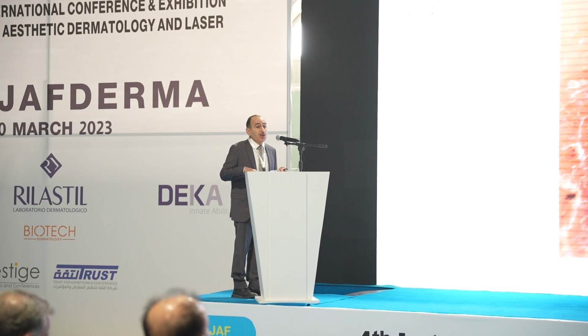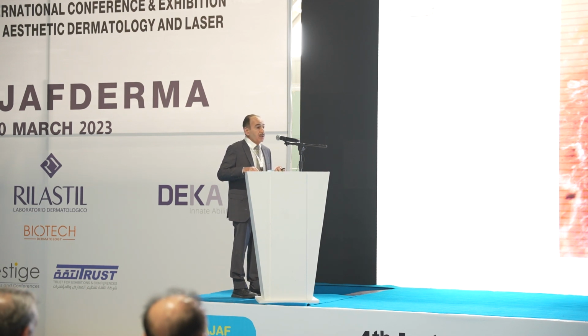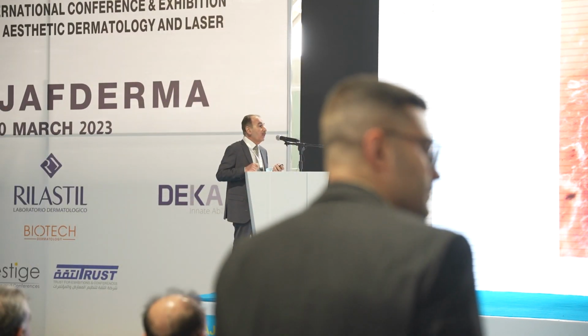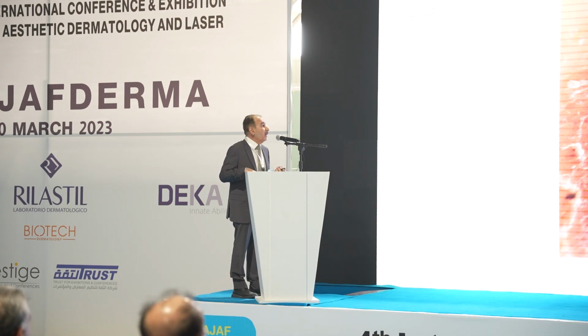Another psoriatic lesion, characteristically, you see it clearly. These are not only dots and globules, these are bleeding. RBCs have extravasated outside the blood vessels. Also, a characteristic feature of psoriasis, it is equivalent to Auspitz sign. When we do Auspitz sign, there will be pinpoint bleedings. Also in this picture, you see the white scale.